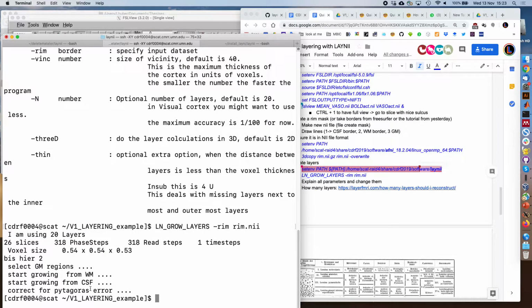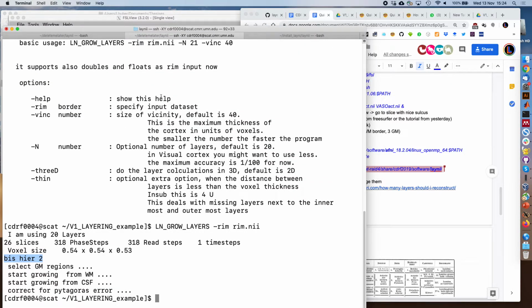Does that work? No. Okay. You cannot open the laptop. You cannot copy it. The reason is, sorry. Don't worry. Yeah, that's a debugging thing. It doesn't crash until here. Sorry about that. It's still in there. I'm not sure why.